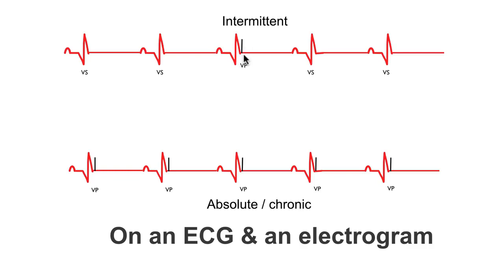You can see here it delivers its output pulse, which is signified by this pacemaker spike, but actually it fails to depolarize the tissue. The reason is that the tissue has only just depolarized and is now repolarizing and is refractory. What this means is no matter how much electrical energy you deliver to tissue, when it is only just depolarized, it will not be able to depolarize again.